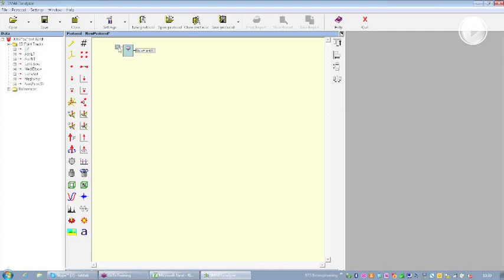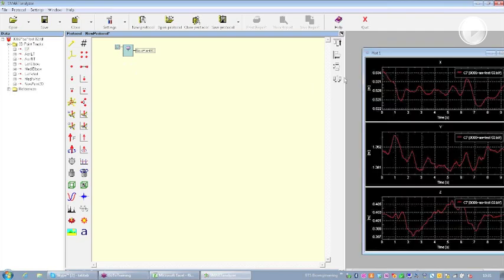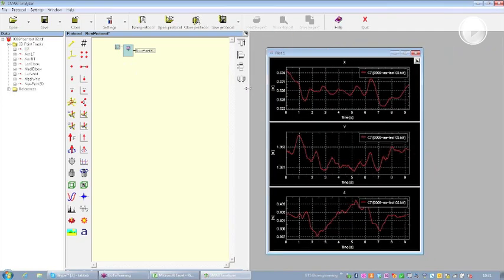This is the old movement, and this is the new one. You can see that in this case they are completely the same, but we don't know every time that we are going to use this protocol again, which is going to be the quality of the track that we acquired.